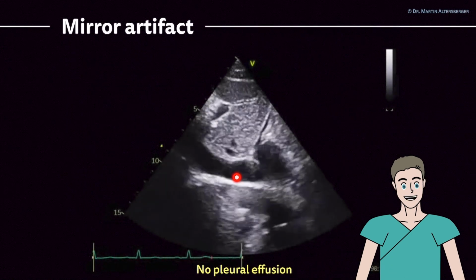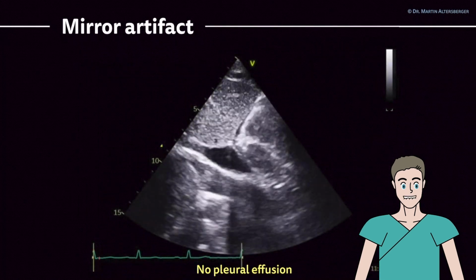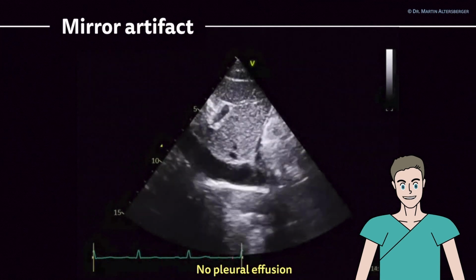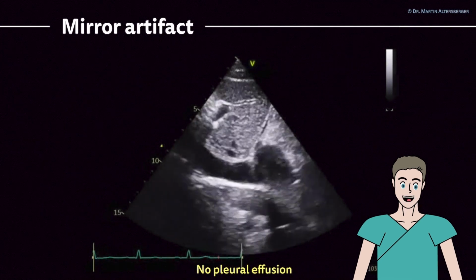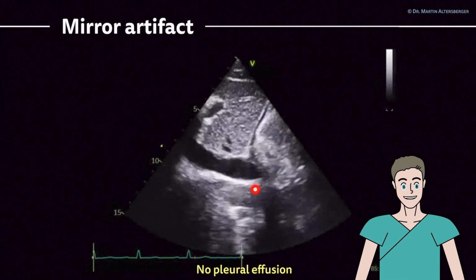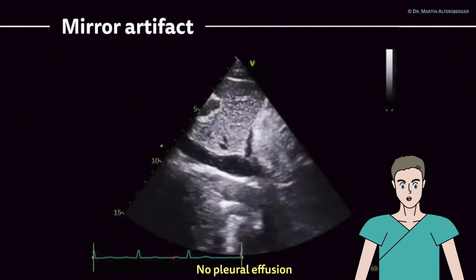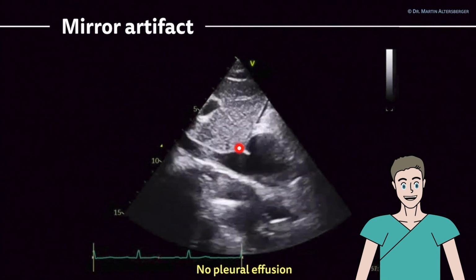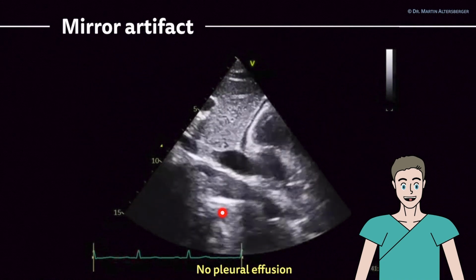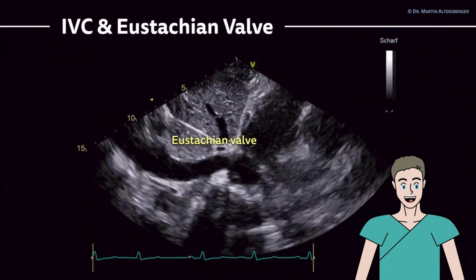Of course, it's not a heart. It's this hyperechoic line, which is representing a mirror. So this is a mirror artifact. The pericardium, the lungs per se, so the pleural line and the diaphragm, they can act as mirrors and create those artifacts where the machine simply thinks that the structures from the scanning above this highly reflective zone continue into the depth as well. But this is not pathological, it's simply an artifact.